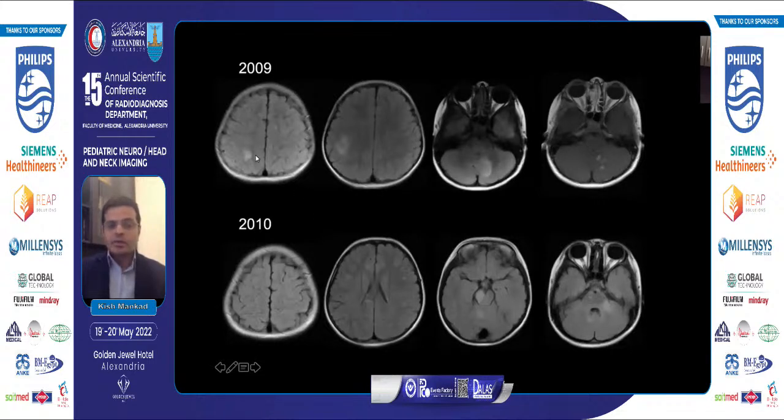The lesions do not look typical for multiple sclerosis. The lesions are subcortical white matter, and in fact, they can be frankly cortical as well. They are quite confluent, cloudy lesions, wisp-like lesions. Big lesion load in the posterior fossa in the cerebellopontine region, as well as the cerebellar peduncles, along with the fact that when you give contrast, you get not rings of demyelination kind of enhancement, but more nodular or micronodular or punctiform enhancement in these areas.